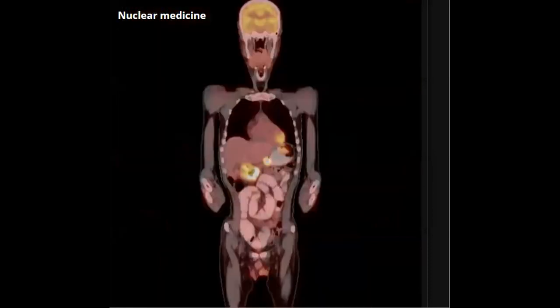Melanoma. Yes, this case was melanoma. Excellent. Bravo. So as you see, the same interpretation, but just in another type. You have to arrange your information, your study, and the examiner will be very happy with your answers.